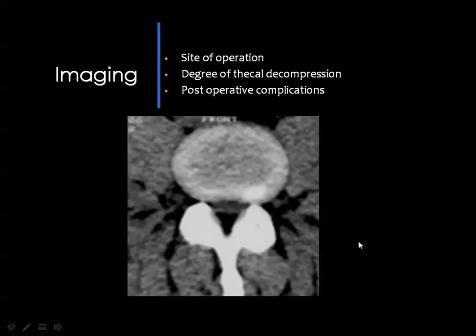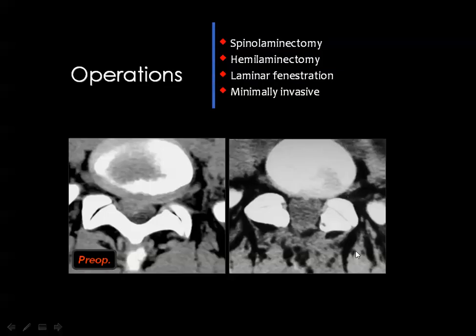But in the current days, where the minimally invasive surgeries are in common use, we do not need to have these two comments, but we are interested now to look at if there is any post-operative complication. And the surgeries, as you can see, we have too many types. The first one was the spinal laminectomy.